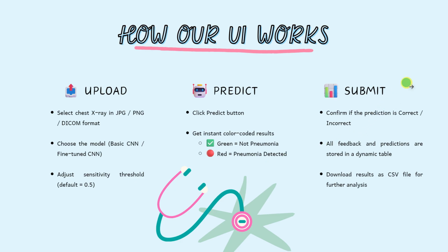Finally, you can submit feedback. Mark if the prediction was correct or incorrect. Everything gets stored into a table you can download for analysis. But here is where it gets interesting. We did not just build one model, we built six different AI models, each with its own strength. Let me show you the actual interface.